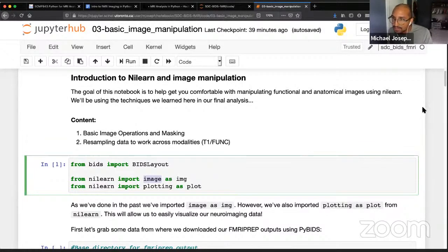So Paul had a question. I went through all the notebook files yesterday and noticed that for the later ones where you remove the first 4 TRs, the data is sliced after the 4th index.